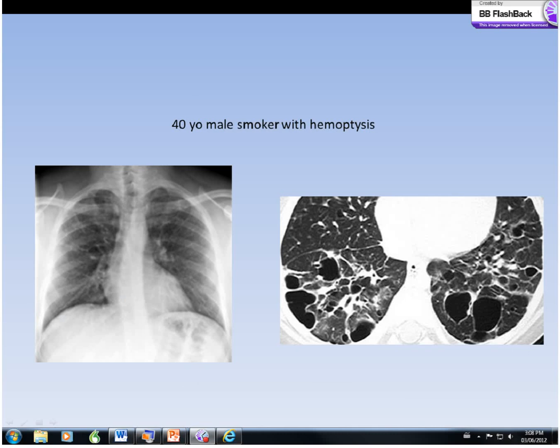I want to turn our attention to a different pathology now. It's one we outlined earlier, cystic lung diseases. So again, these fall into the low attenuation. I'll just skip right to the CT because it's air-filled, and compared to the lung parenchyma beside it, it's low attenuation. It's cystic because the walls have a thickness less than 4 millimeters.